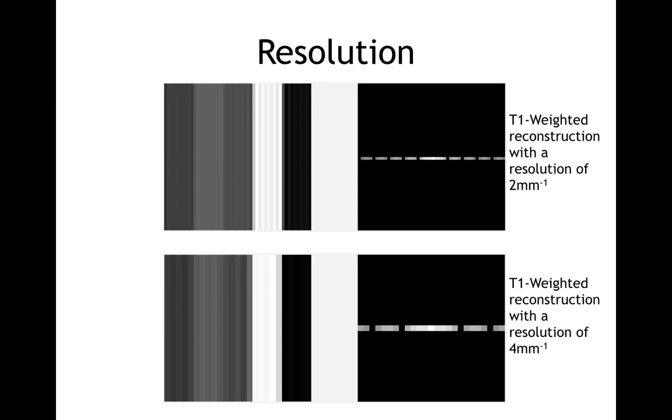This is because the scanning is done in the x direction and the decrease in the number of samples causes a worse reconstruction. The change in the k-space representation is also noticeable, as it is clearly seen that the amount of information is decreased with fewer samples.